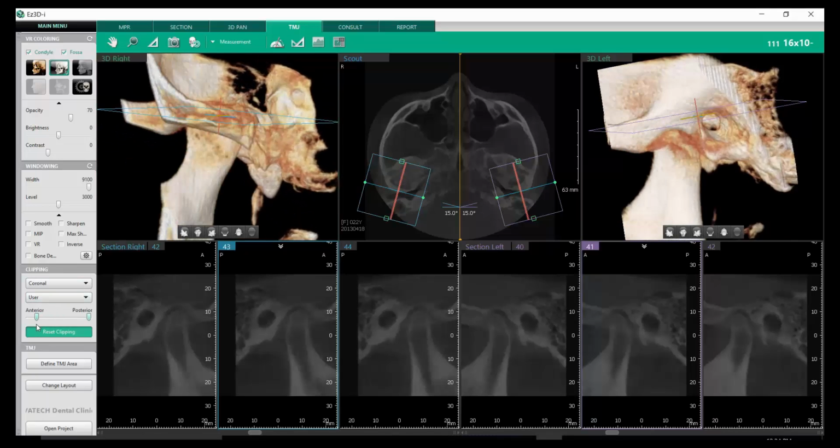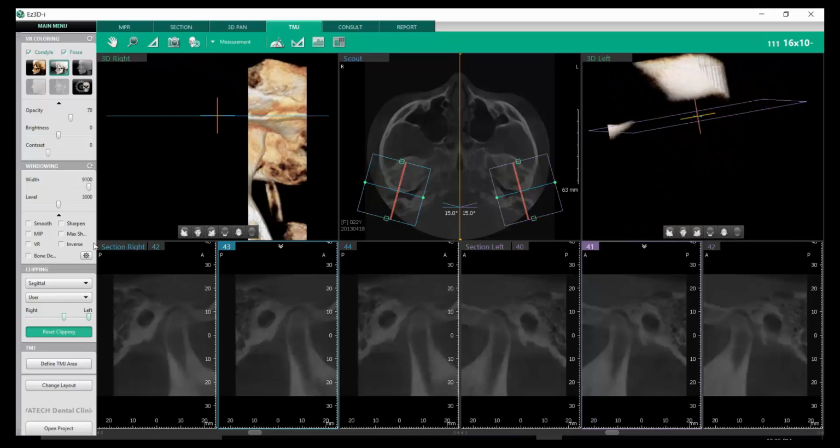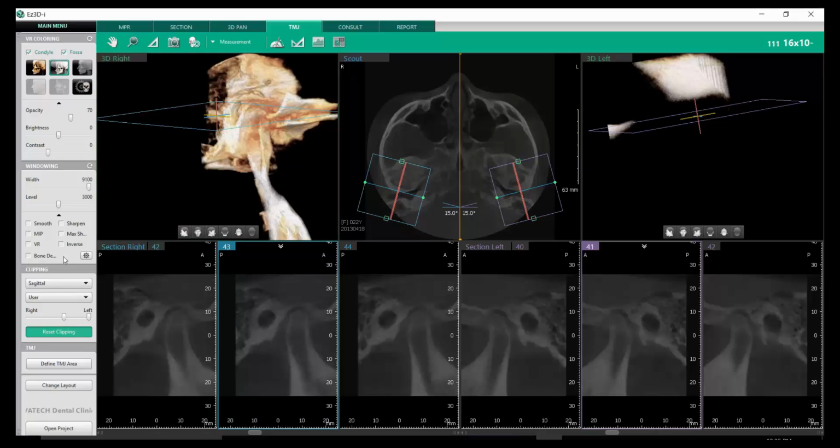and then left clicking to rotate around the 3D rendering itself, or going posterior anterior to rotate around from the other direction as well. We can also do a sagittal, then going from left to right or right to left, and then rotating your view.